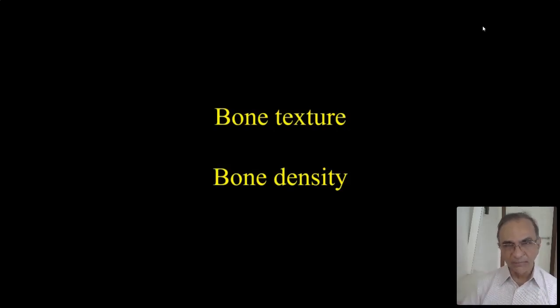If you've not seen a patient with scurvy, if you have not seen a patient with Rickets, remember these words: coarse trabecular pattern, crisscross trabecular pattern is when you see abnormal texture, and when there is uniform featureless pattern, you will call that a soft or non-coarse trabecular pattern. Bone texture is often abnormal in metabolic bone disease. It is not so frequently abnormal in skeletal dysplasia.